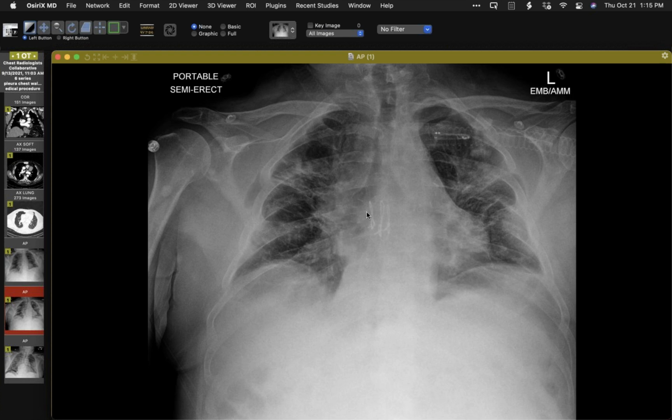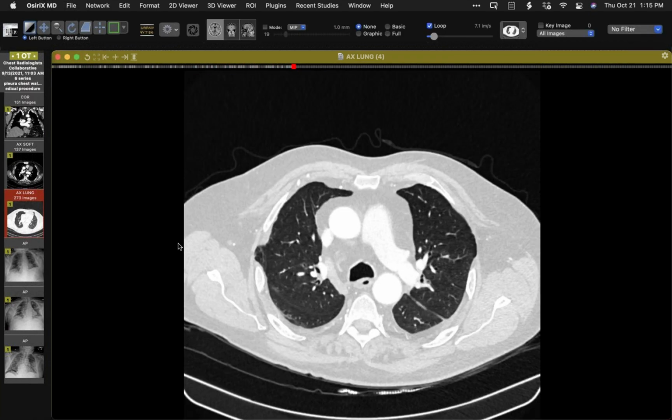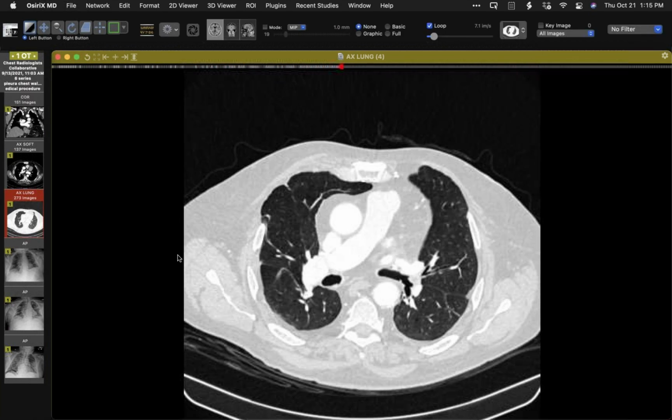Because of the symmetry of it, one can reasonably surmise that we have the clamshell incision that goes like that and like that. And in relation to the lateral portion of the clamshell incision, we have no really restraining intercostal muscle.